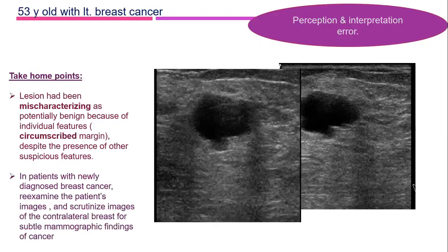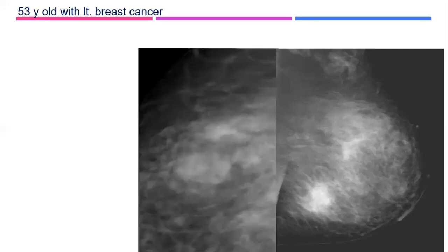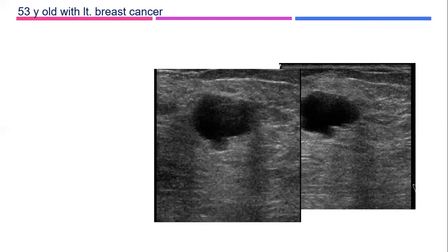No. The pathology. The surgeon palpated the lymph node, and they came to me discussing the issue of the right lesions. After that, I could recognize that lymph node is suspicious. They had taken a biopsy and it proved to be malignant. And then the patient received the chemo.